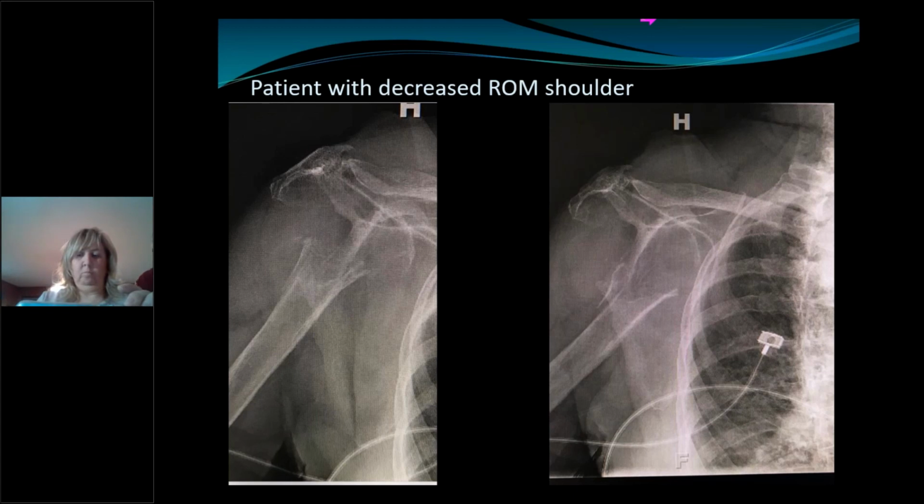And if you look at it, there's really something missing here. You see the proximal humerus here, but we don't see the ball at all. And what we believe happened is she had a fracture at one time. She probably sustained an injury, broke the proximal humerus, never had it fixed, and ended up with avascular necrosis, and the head just died. So this is a very complicated problem, because now she's got this stem and basically a pseudo joint, a false joint, but it's all connected with soft tissue.